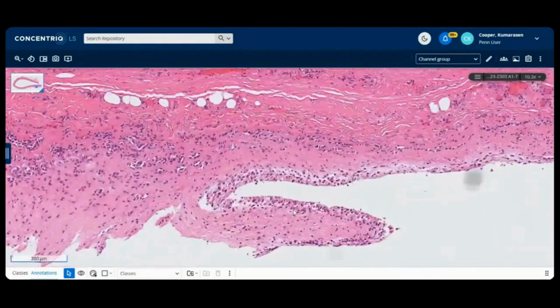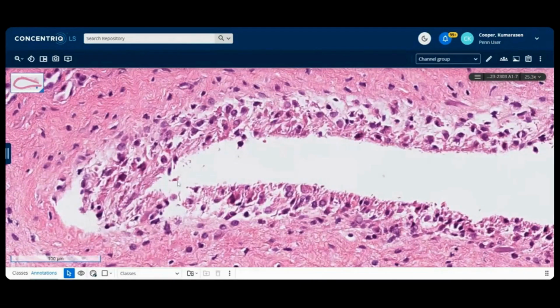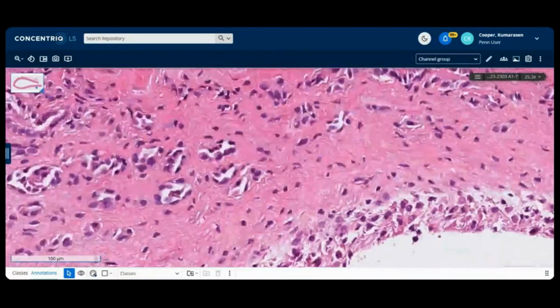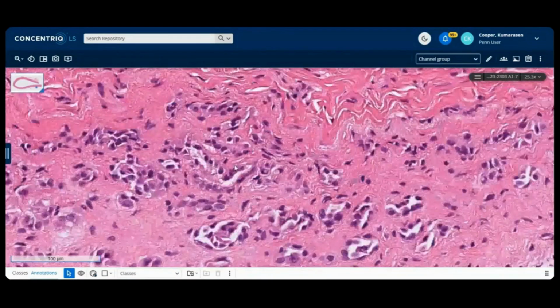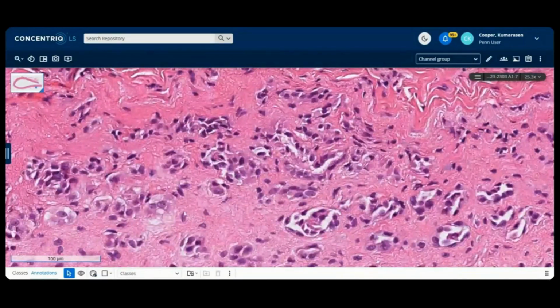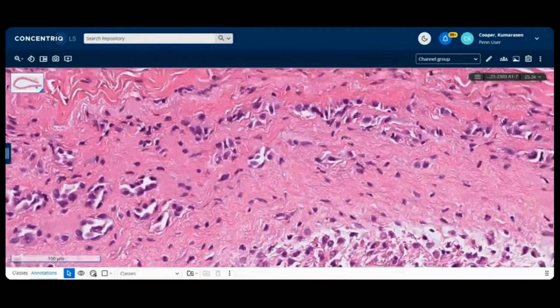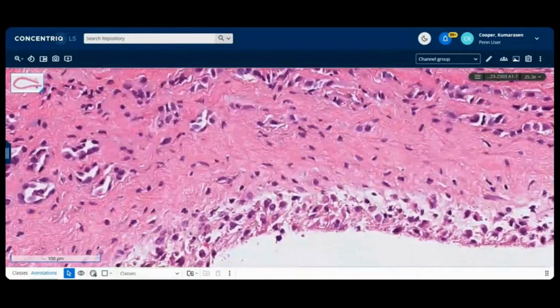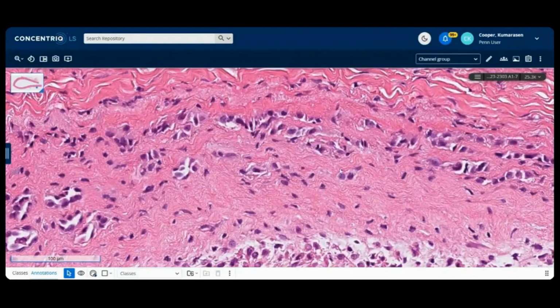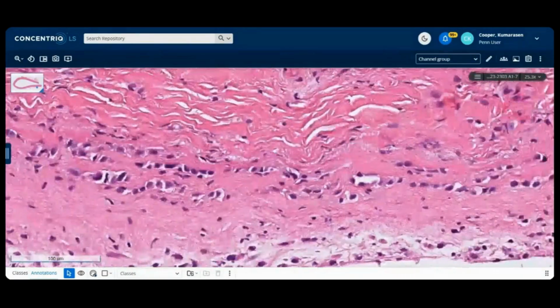fibrosis of the adventitia. And then here you have these cells, sort of pinkish, largish cells, pink and large, and then here's more of them here. I don't want to use the word gland-like. I don't want to confuse you, but you can see these somewhat uniform-looking cells, little cords and nests, pink cytoplasm. Okay, these cells, those and these are probably the same. Here, these are embedded in the adventitia, and you can see these cords and nests of cells.